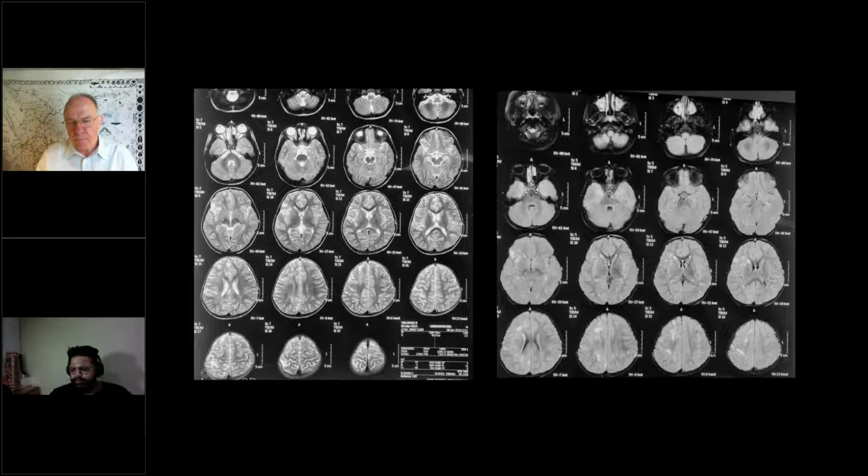So hypoperfusion can affect predominantly one hemisphere. Is that right? Hypoperfusion injury. It is quite unusual to do that, but any embolic phenomenon from the maternal fetal placental unit could do that, as well as the fact that this could still be infection, but it's unusual to again have it all on one side. Because I thought, Nihal, you can correct me, the left side is totally normal, isn't it, on right-sided images, or do you have some there as well?